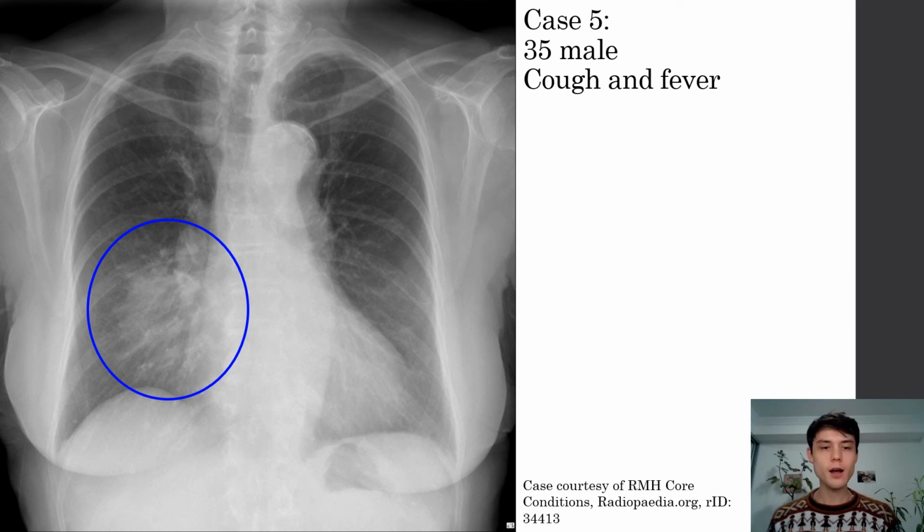Now, when we contrast pneumonia to pulmonary edema, pus and fluid have similar radiographic densities. So we can't really differentiate these two pathologies based on the radiographic density, but instead we've got to be looking for the distribution and, of course, the history. So in this chest X-ray, we have a well-demarcated consolidation, and this is going to be consistent with lobar pneumonia.